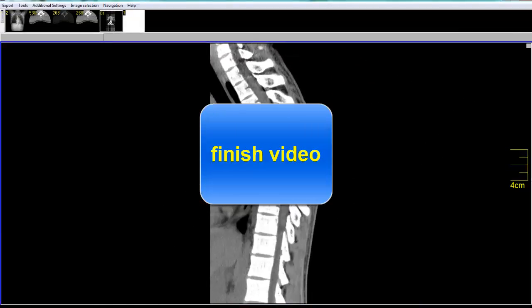And just like infection at a disc can spread to the front or to the back, tumor in a vertebral body can spread also to the front or to the back. So in the front, again, you'll see a prevertebral tumor, soft tissue mass. And in the back, you can get epidural tumor, which extends posteriorly from the back of the vertebral body into the central canal and potentially causing cord compression. So that finishes a brief overview of looking at the spine for back pain. Thank you.